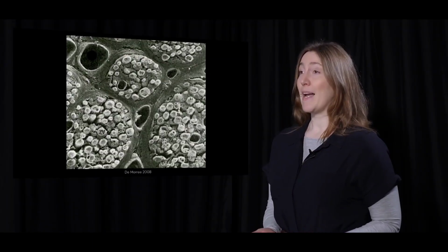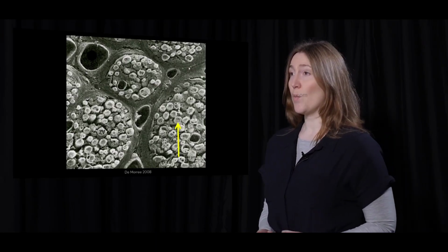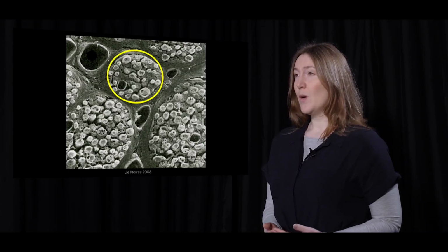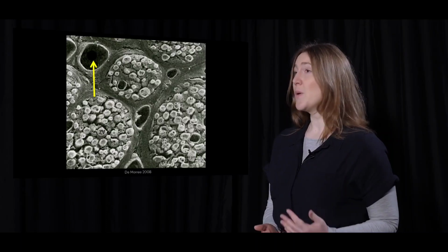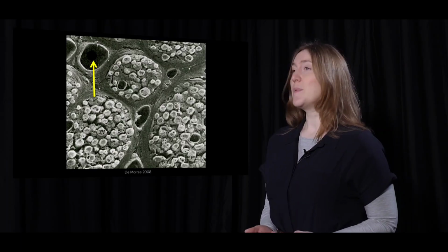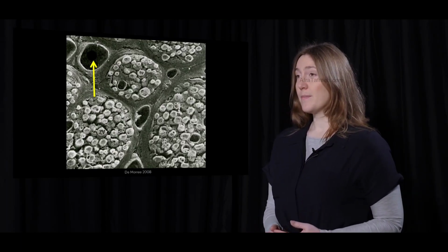Here you can see a magnified transverse nerve. Please note the arrow pointing out one of the nerve fibres and the perineurium covering the whole nerve fascicle. Also interesting to see are the intraneural blood vessels, which run not only between the nerve fascicles but also inside the fascicle. The arrow in the images is pointing one vessel out, but many more can be seen.